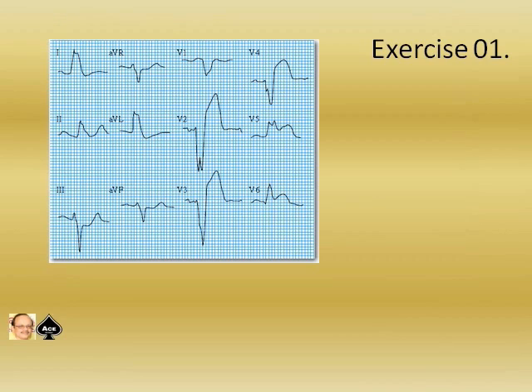Now look at this exercise number 1. I will give you a total of 30 seconds. Please make a diagnosis.